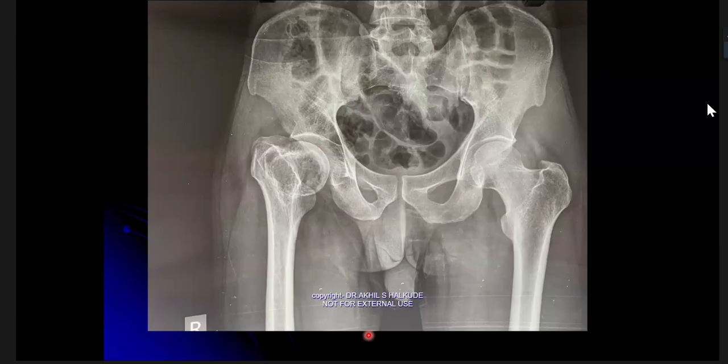Yes, sir. As you said, there is a fracture. What does it imply? Is it a pathological fracture or a routine fracture where the patient has undergone a fall? So it might be a pathological fracture because there is lucency seen in the head and the neck region with adjacent sclerotic margins. Very good. So a narrow zone of transition, no soft tissue component. Very good. So what is your diagnosis based on this?